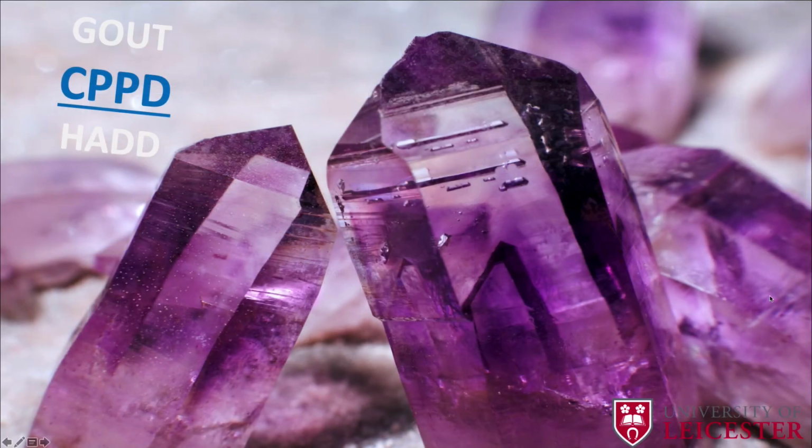So that's a couple of things that we've covered with gout. We've looked at cross-sectional imaging, radiographic imaging, and also ultrasound imaging. And hopefully when you go on your rotations, you'll have a good understanding of the different radiological manifestations and possibly some of the requests that can be put in to further evaluate these kinds of patients. Next thing we're going to talk about is CPPD, also known as calcium pyrophosphate deposition disease.